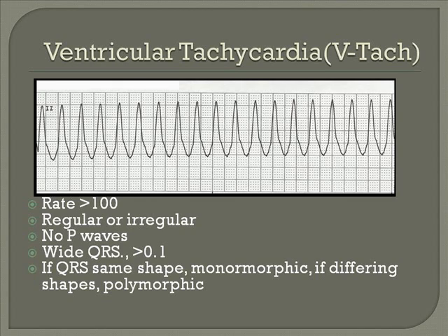This is a fatal rhythm and needs immediate intervention. This person needs immediate cardioversion, which your doctor will hopefully prescribe immediately and begin. This person will likely be awake at first when this happens, but they will lose consciousness eventually. And if you are going to shock them, it's a good idea to let them at least pass out first before you shock them.